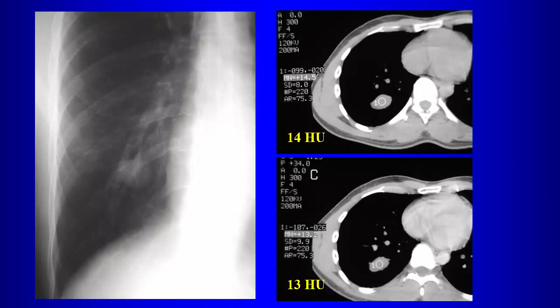So do bronchogenic cysts occur in the lung parenchyma? They can. About a third of them can. So the bronchogenic cyst isn't excluded from the differential. What else could this be? If this was in the fissure, what would you call it? A pseudotumor, right? You could have loculated fluid in the fissure, so that could be a pseudotumor, right?